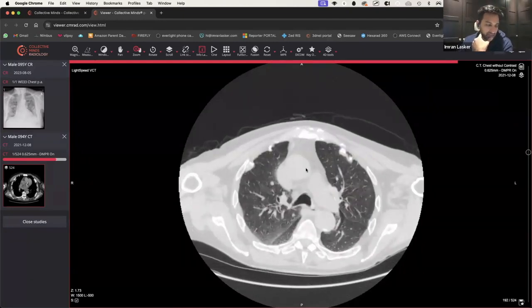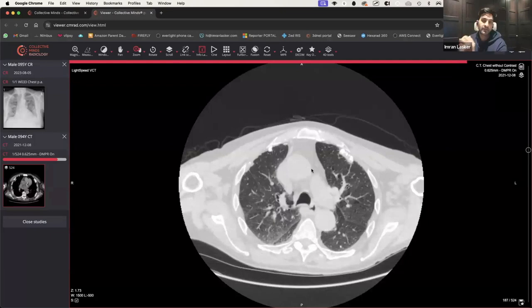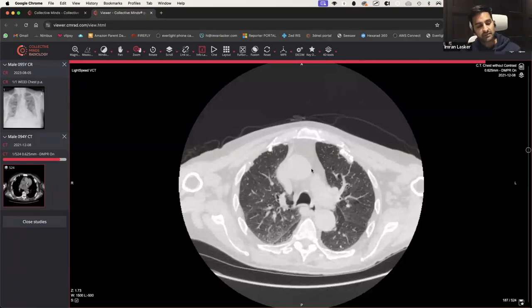I didn't put asbestosis as a choice because I thought it's fairly easy. That would be the primary cause for this, undoubtedly. There are multiple reasons for pleural calcifications. It can be infection. It could be a pleurodesis because someone's trying to reduce the chance of having pleural effusions.